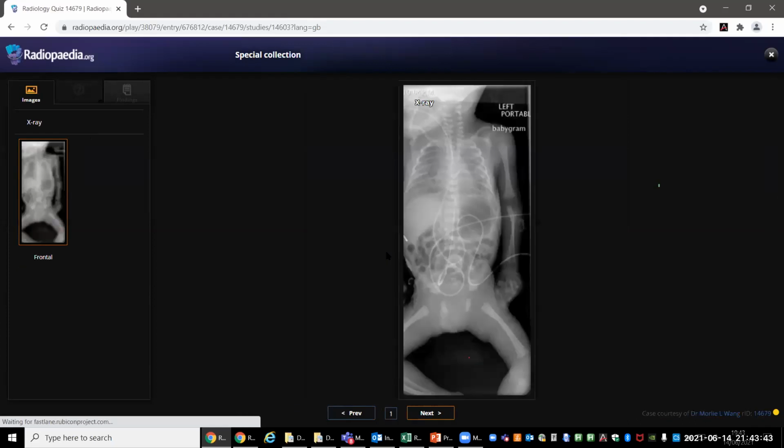The one before that was malpositioned tubes basically with RDS, and you did it very well. This one was actually going from the IVC into the right atrium, through the patent foramen ovale into the left atrium. So that was fantastic, really.